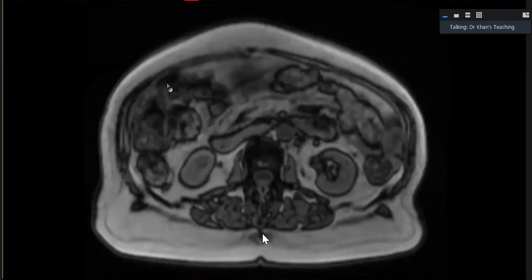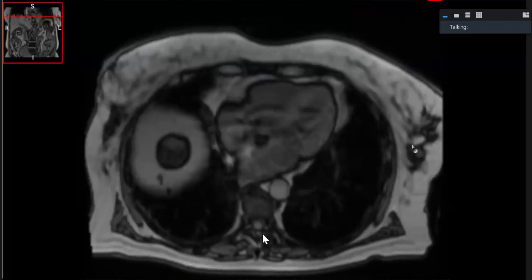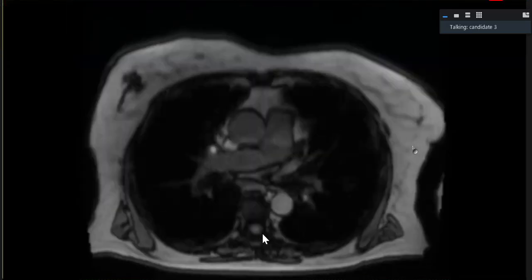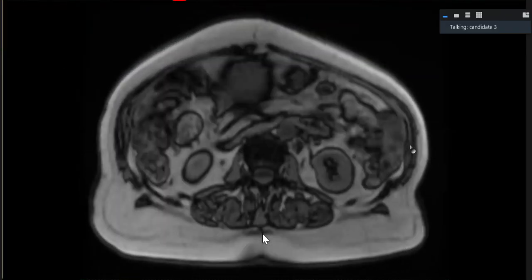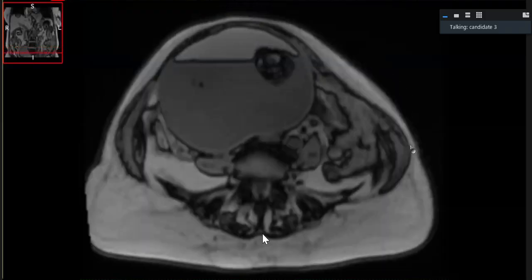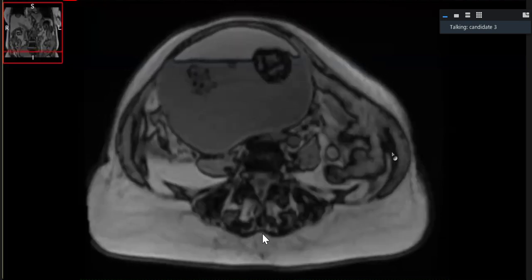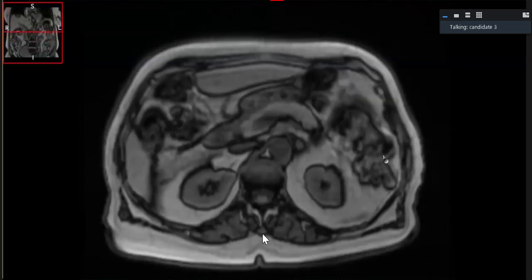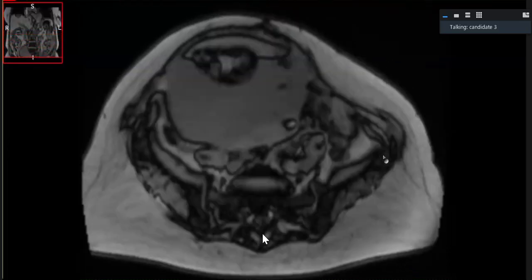I've given you a T1 weighted sequence. Okay, sir. Thank you. This is axial T1 weighted image. Okay, here I can see that the anterior non-dependent altered signal intensity on T2 is bright on T1, which is suggestive of fatty component in it. And few signal void rounded areas are also visible, which are more calcific signal intensities. Okay, lower part is not included. I think only part of abdomen is included.